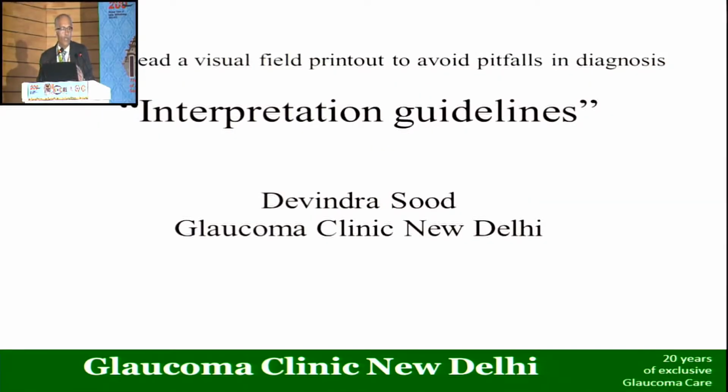So now, what Dr. Patyal has emphasized is that you can have well-done fields and they may be poorly reliable. And then you could have fields which have not been done well in terms of reliability indices, and the fields may be reliable. So don't jump to conclusions, and to avoid errors in diagnosis, this is what you've got to do.